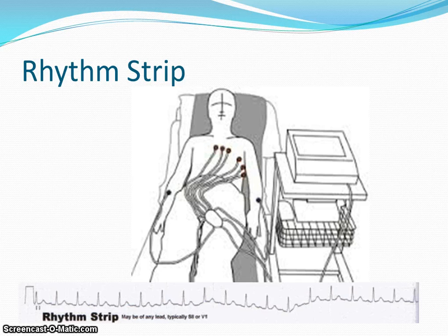So conventionally, when performing interpretation of a rhythm strip, you must examine atrial activity, examine the ventricular activity, identify if the conduction is A to V or V to A, look for interference patterns, name the rhythm by what is happening and recognizing the rhythm strip pattern. There may be more than one type of rhythm on the rhythm strip.